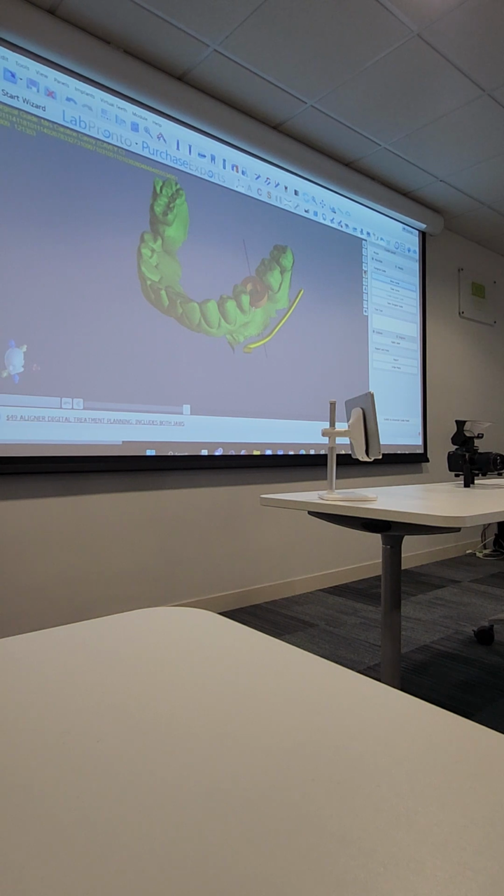The panels here, I explain the panels, it's very easy access to the different features. If you go to surfaces, you can turn on and off the different surfaces and layers that you are using. If you go to the implant list, if you've got 10 implants, you're going to have a list of your implants here.